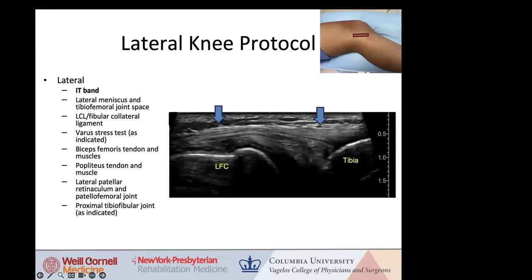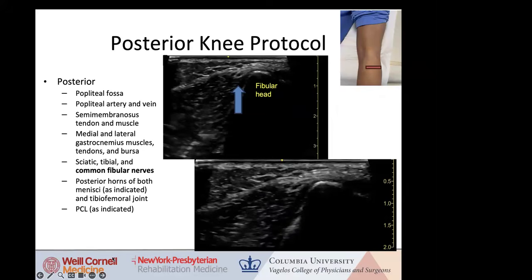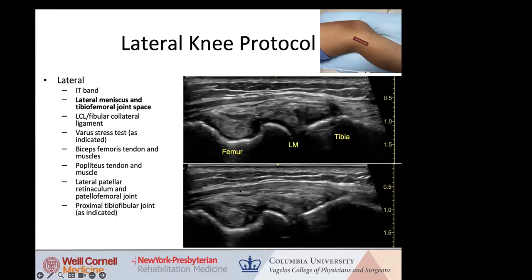I just want to shout out or underline what Brennan said, and that is that one of the usefulness of ultrasound is to look at the lateral compartment and look for marginal osteophytes in DJD, which we do see in this case, both marginal osteophytes and degenerative type changes to the lateral meniscus. Because I found that DJD of the lateral compartment is a different beast. It can present with lateral lower leg pain, posterior lateral pain. It can be very difficult sometimes. And I think, as in this case, the popliteus tendon is part of that whole process.